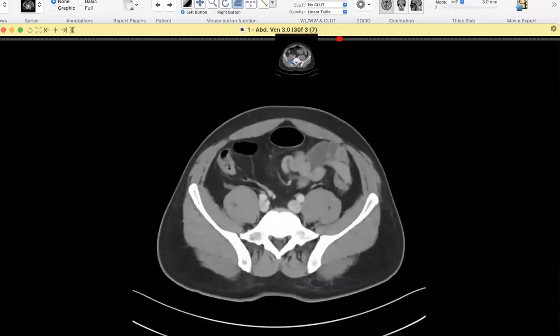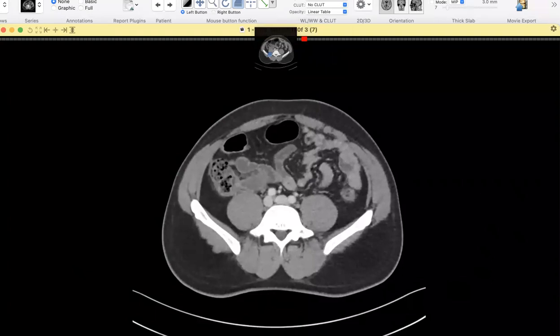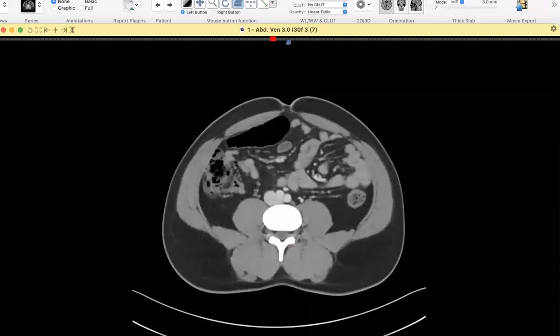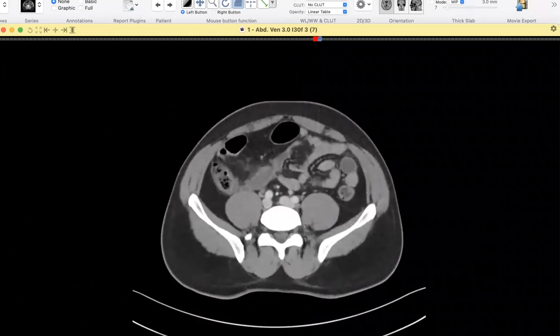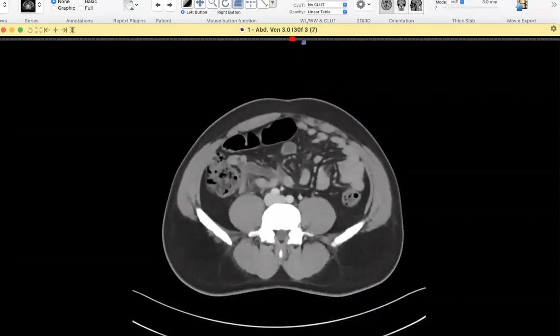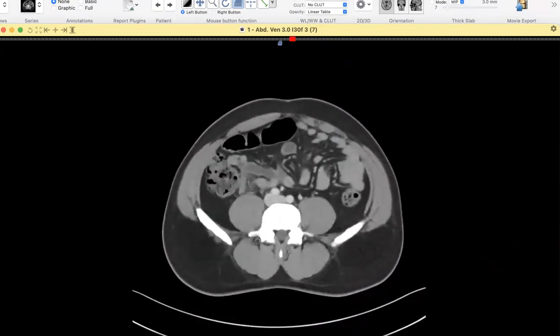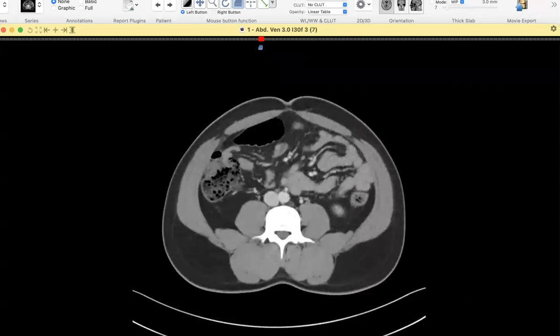Can you show me the inflammatory change? Just a minute. I think there is surrounding subtle fat stranding around it. However, the first possibility of mucocele must be considered. What is the most common etiology of mucocele?